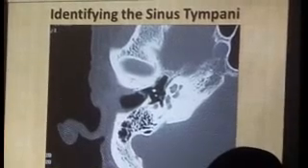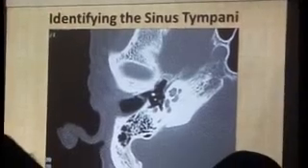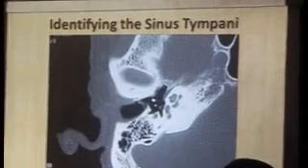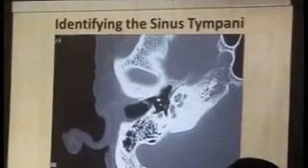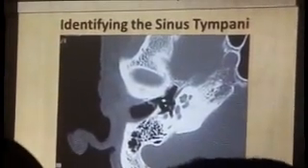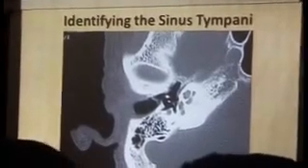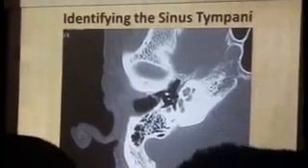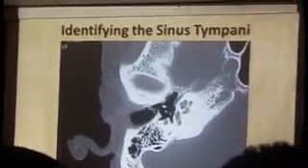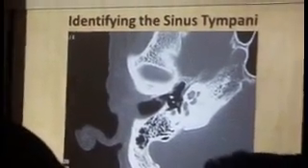Right? So before I move on to the coronal sections, I would once again like to reiterate that this is one section that you should have while you are interpreting a CT temporal bone. And I'm not saying that the other segments are not important. In fact, however much I reiterate, it would be much less: scans should not be read in isolation. They should be read in continuity, axial superior to inferior and coronal posterior to anterior. Don't just pick up an image and try finding your way out. There is a chance that you could make a mistake.